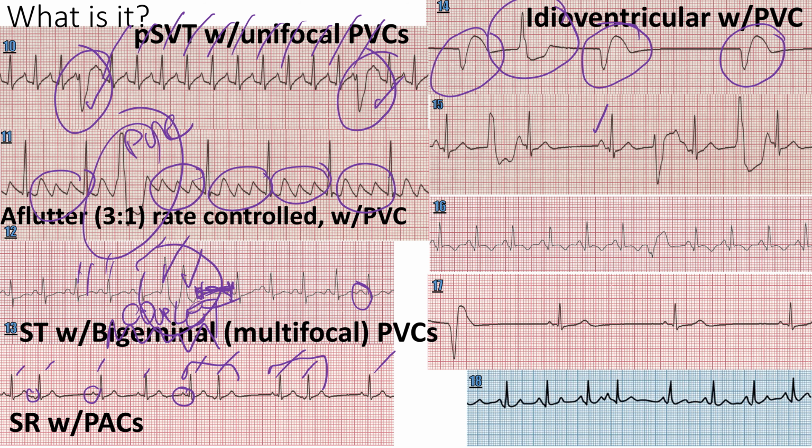We got a P wave, we got a QRS followed by a QRS, and we got a PVC here, PVC there, PVC there. How do we know it's not a PAC? Because it's wide, right? And I know my normal rhythm is narrow, so it's a wide complex thrown in the mix here. So also what's concerning here is it looks different every time. That's called multifocal PVCs. Do they happen every beat? Just about, yeah.